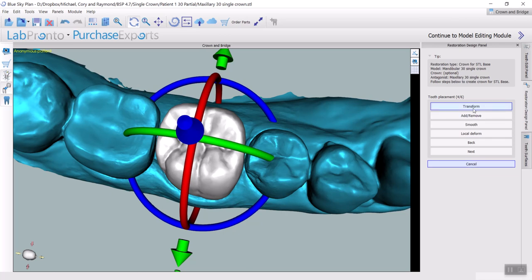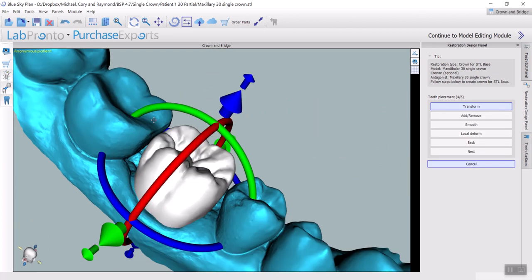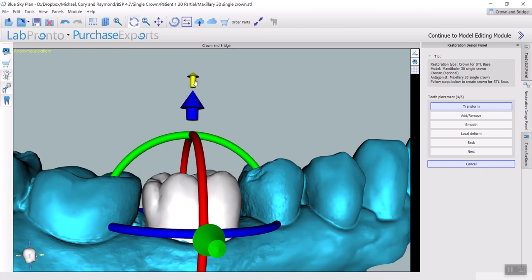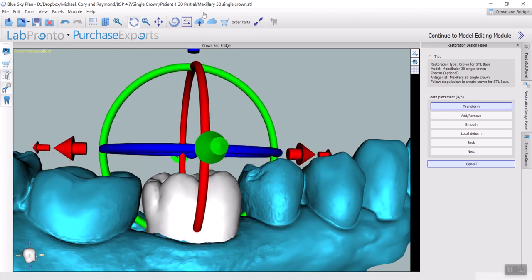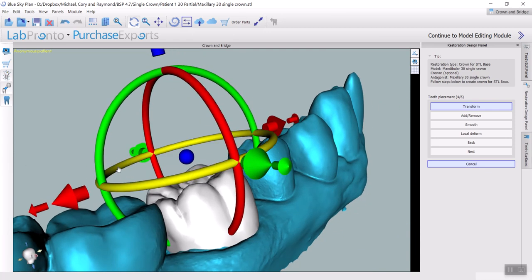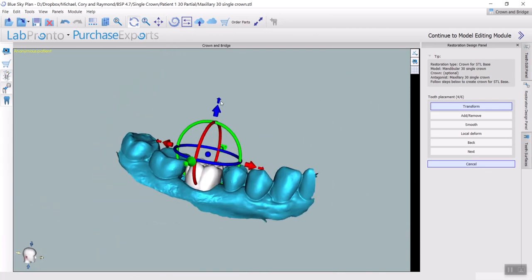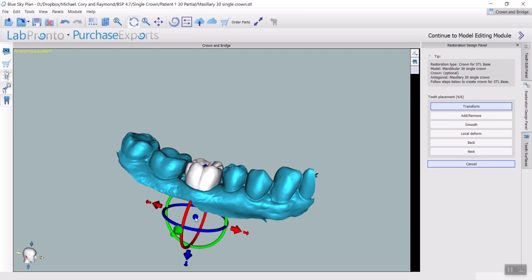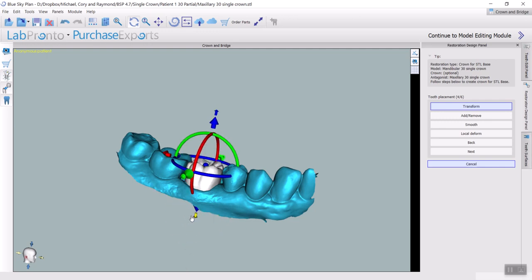Number one, the transform tool is the widget that we can use, as you know, moving the arrows. The small arrows are just for you to know the center of rotation or the pivot of the widget. Okay, we can move that center of rotation, and whatever is in the middle of this point will be the part that we will be pivoting from.